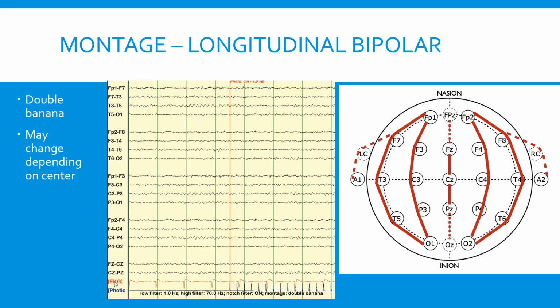And then down here, for each EEG we always do an EKG. We always have an EKG to monitor the heart as well. So down here, just remember, we also have the EKG. Don't confuse it, that's not the brain. That's just the heart, a single channel EKG. All right, everyone with me so far?